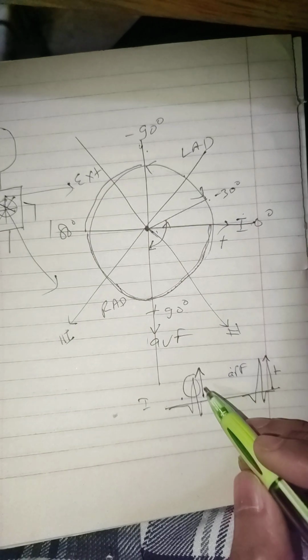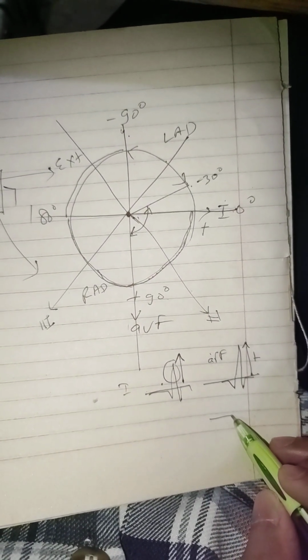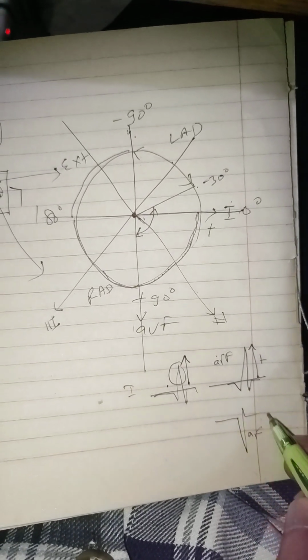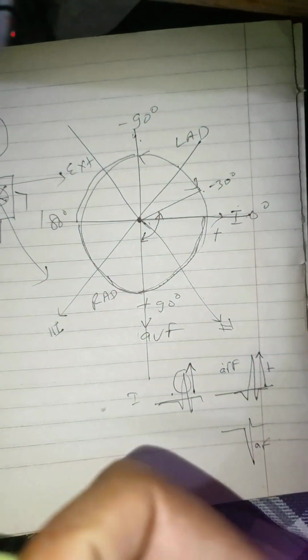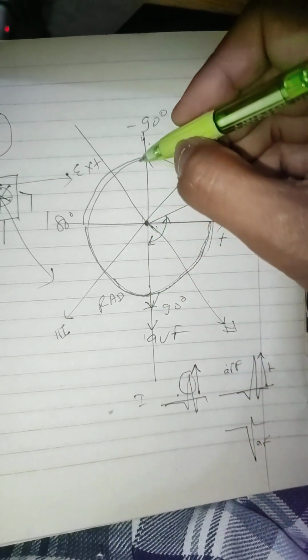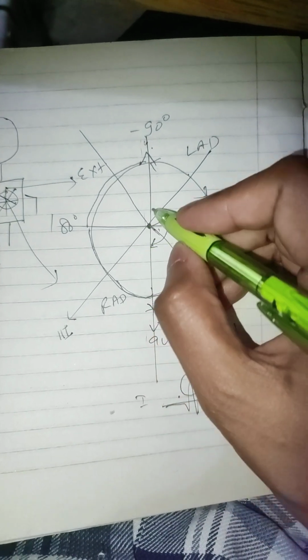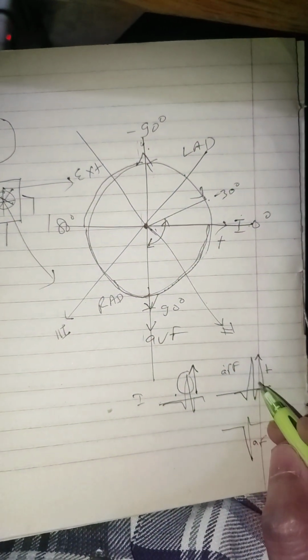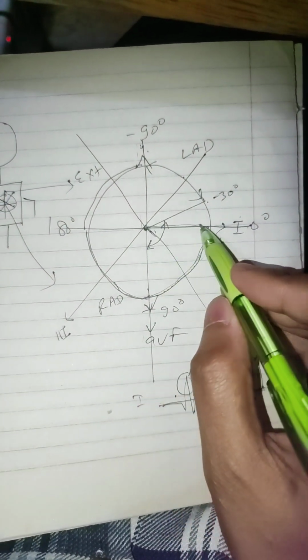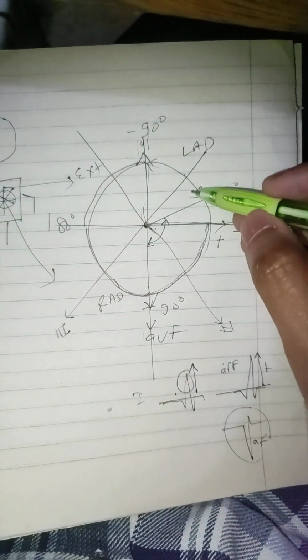But let's say lead 1 is positive, but in AVF the predominant wave is negative, like this. If it is negative, then this is the positive direction, so the negative direction will be this. So this will be the direction of AVF, because it is predominantly negative and lead 1 is positive. So lead 1 is positive and this is negative. So the axis falls between this range.